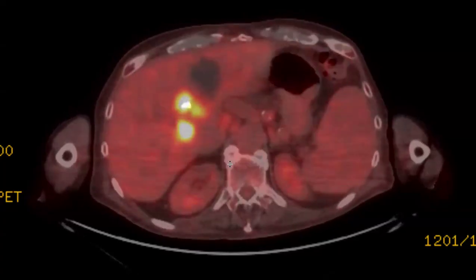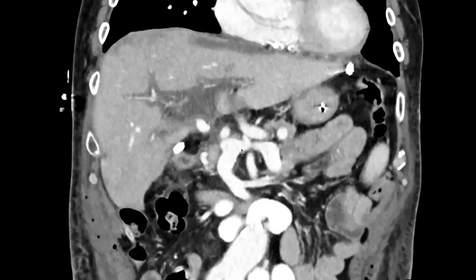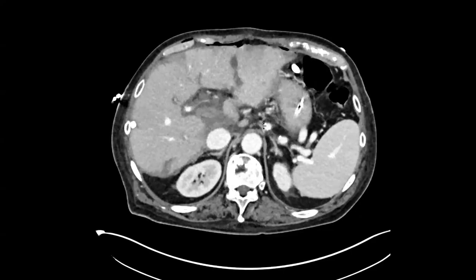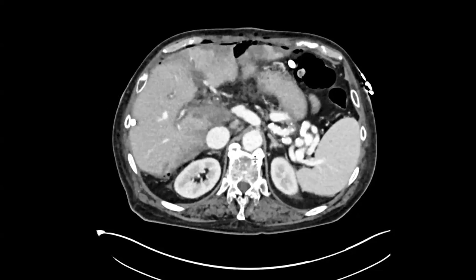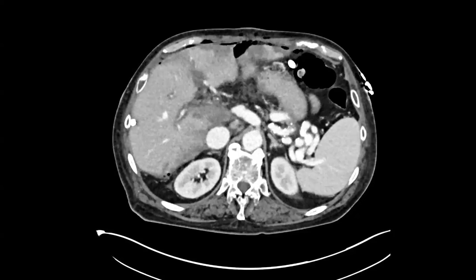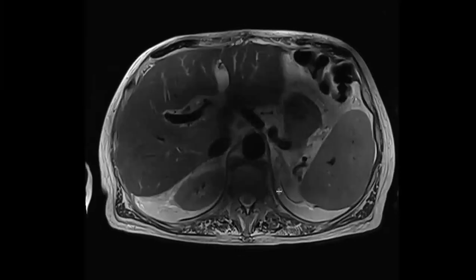But the immediate post-op scan had already started looking abnormal. Yes, and that's a great question, actually. Let's look through that. There are definitely vascular complications. We start to see an abnormal geographic enhancing region, and then on the MR that's done, there are multiple MRIs. This is the first month post-op.